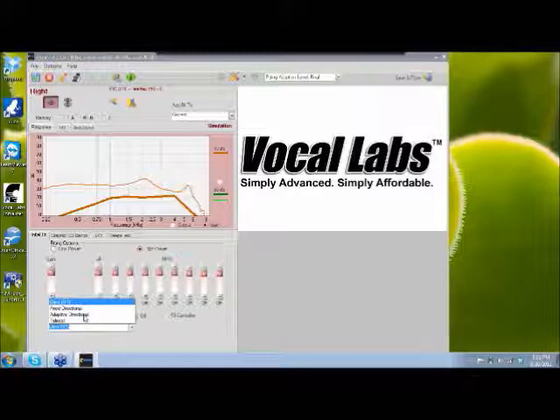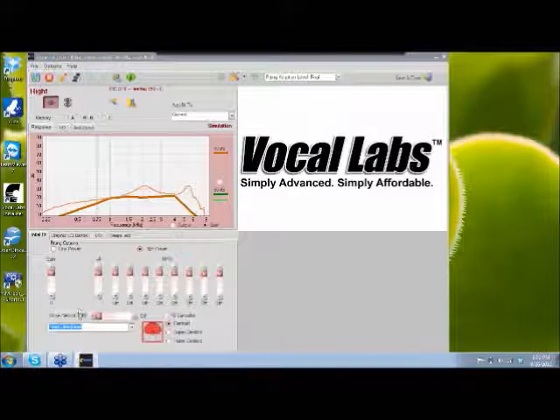And when it's not more beneficial, it will stay in omni mode. Now for your noise mode, you could use adaptive directionality and it will work great. But if the patients work in a noisy environment, or they go out to dinner a lot and they're in a noisy environment, maybe you don't want the hearing aid adjusting so much and you just want to make it a fixed directionality, okay, for our second memory.